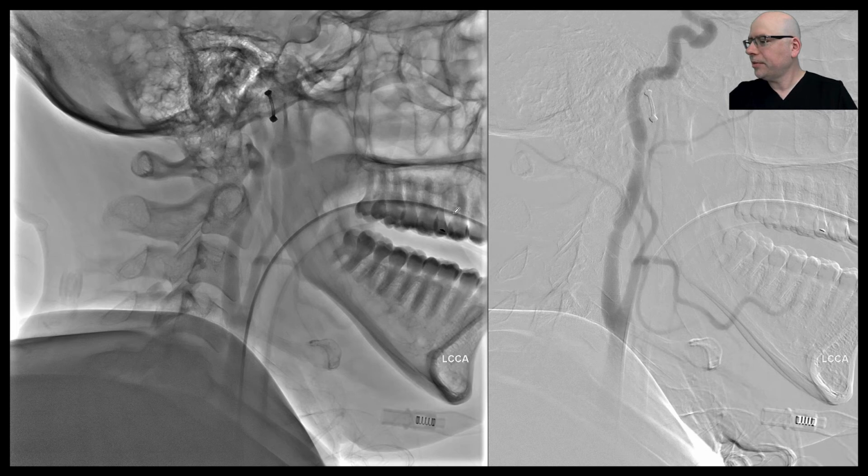Yeah. So in this particular view, your occiput's back here. So this would be the occipital artery. We can barely see it, but there is a superior thyroid artery, right there. Other branches would be the ascending pharyngeal, that tiny branch right there. This is the lingual artery. This is the facial artery. You have the maxillary artery also? Yeah. So this is the internal maxillary artery, and the superficial temporal artery is here.